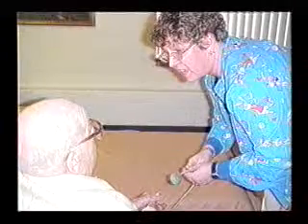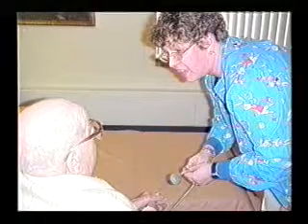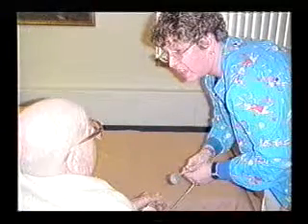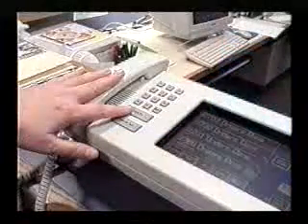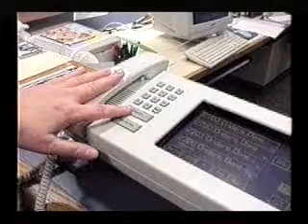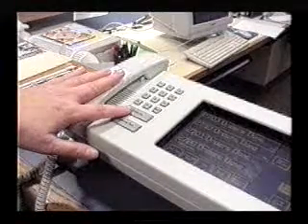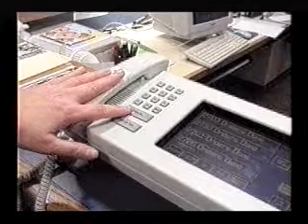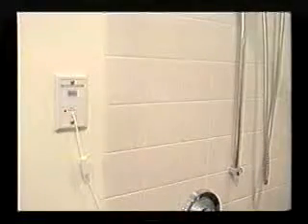The patient needs to be shown how to use that call system, because it would be something that would be unfamiliar to them prior to coming into a healthcare facility. An intercom system that's available in many facilities allows the nursing team members to communicate with the patient from the nurse's station. It also allows the light to be turned off at the nurse's station. Call lights are also standard equipment in each of the bathrooms.